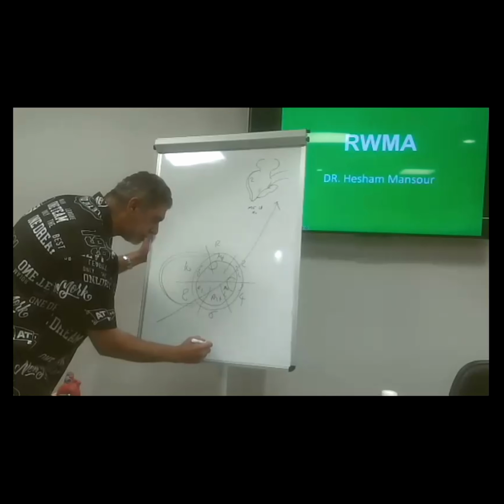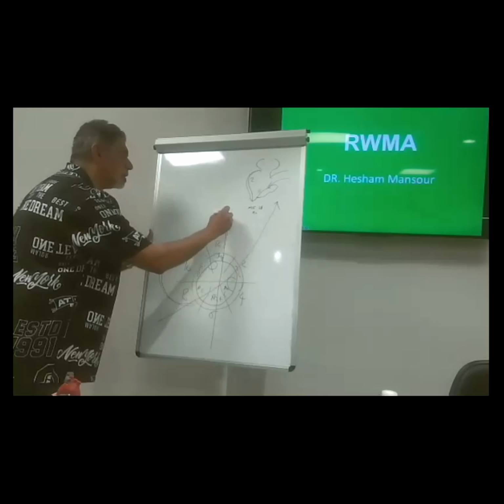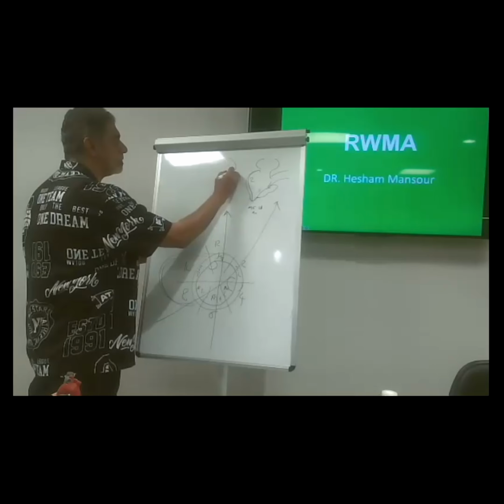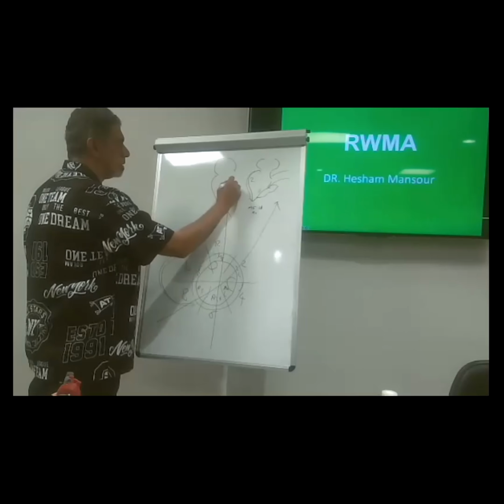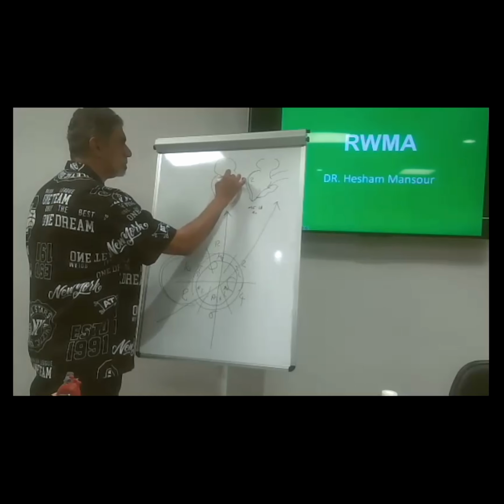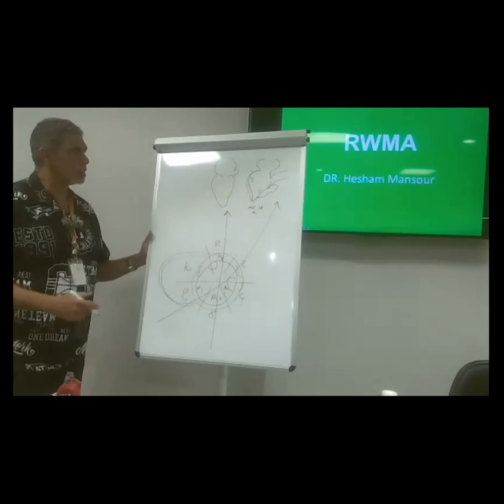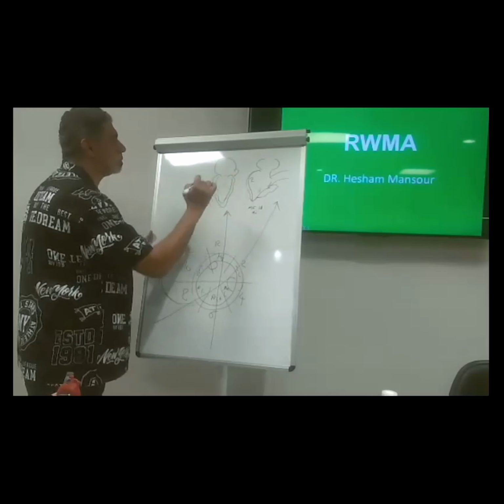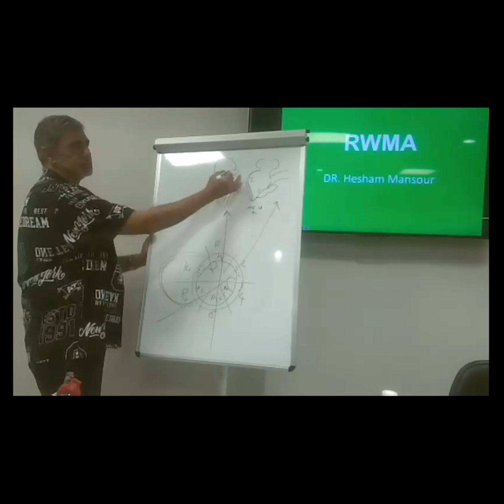I will make the beam cut this piece of cake in this direction. What will I get? Excellent. What's this?